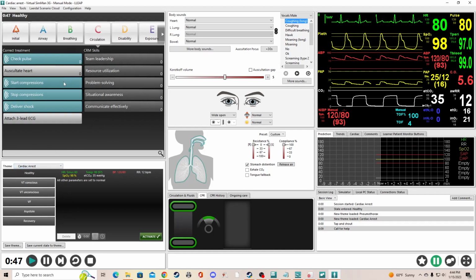But that's all this is, just your counts. This is just note keeping basically, and you can also add actions to them. So we'll move on. The next is your theme. Like, you've already seen me kind of changing them out.